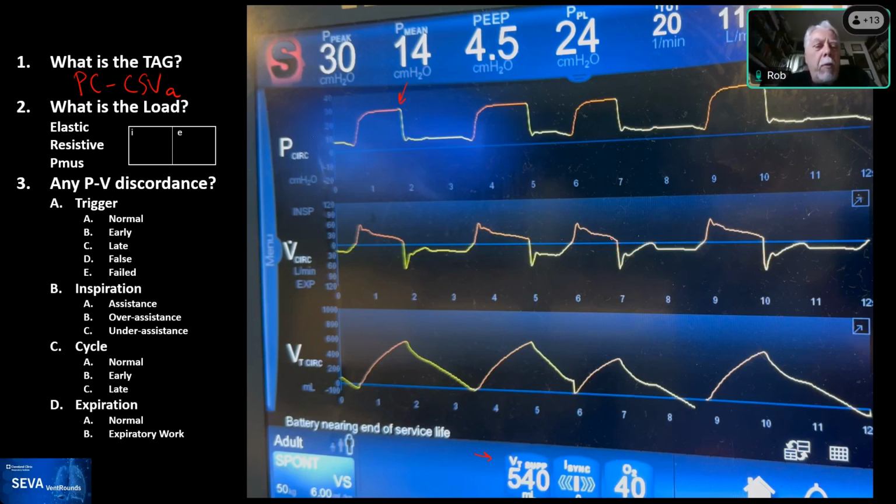Or it could be that the patient has intrinsic PEEP, auto PEEP, and then you're under-assisting the patient because he has so much auto PEEP, so you cannot assist them during that breath. So this is where I'm having challenges on how to classify. This would technically be a patient that has auto PEEP to me, and I would not put him as over-assistance. However, you can see patients in which you have given too much support, and this is happening.